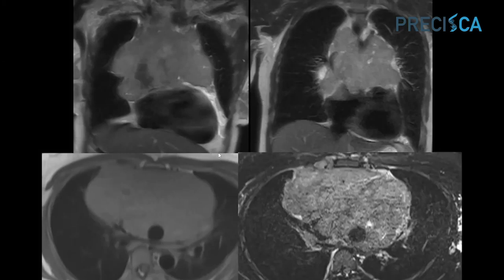We also like to do images in what we call T1 and T2 weighting. The T1 weighting allows for anatomy, and the T2 weighting allows us to pick up pathology. So T2 is very water sensitive. And so when you see something that is kind of bright, you can go back and get a sense of where you are in the T1 images.